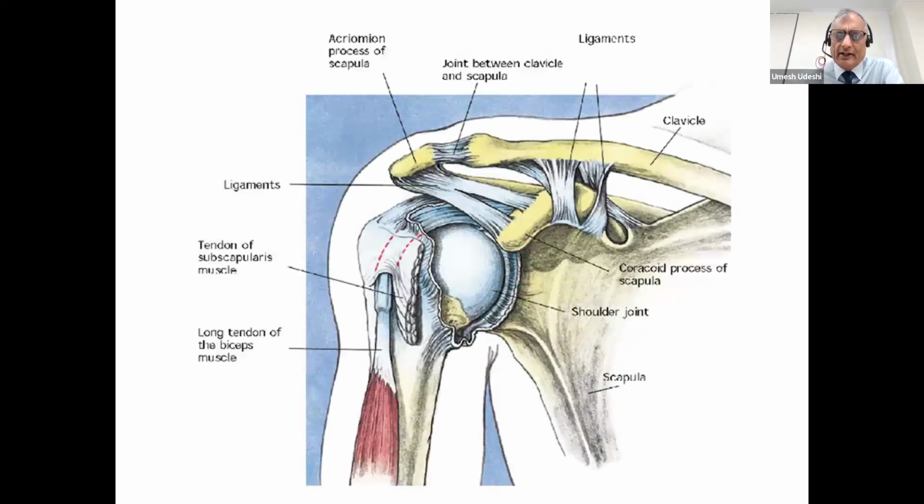So going into the anatomy diagram first of all. An MR scan of the shoulder will include most of this region of interest that we're seeing in this diagram right now. And that's the advantage of MRI over something like ultrasound, where we only get a very small field of view with only what's underneath the footprint of the probe visible. With MRI, we'll see bones, soft tissues, the tendons and the joint fluid, etc.